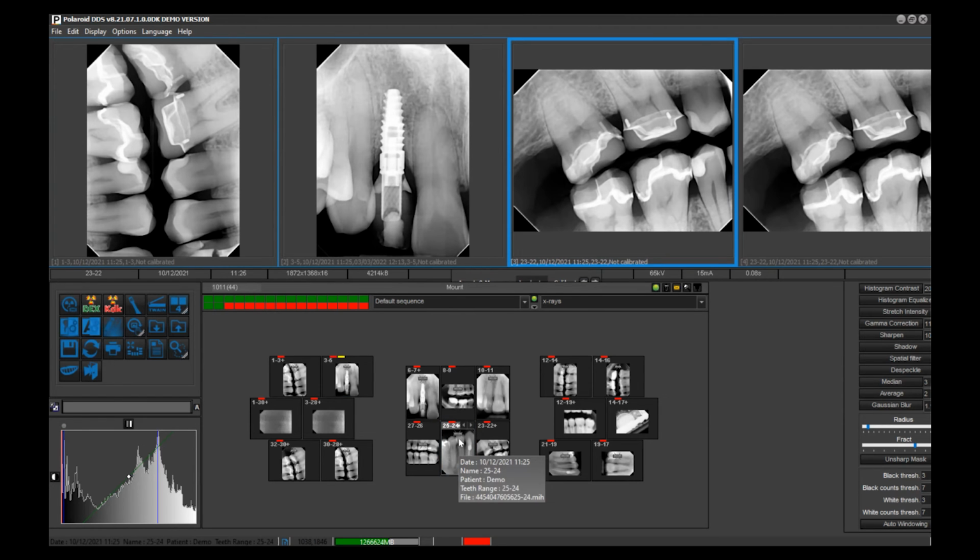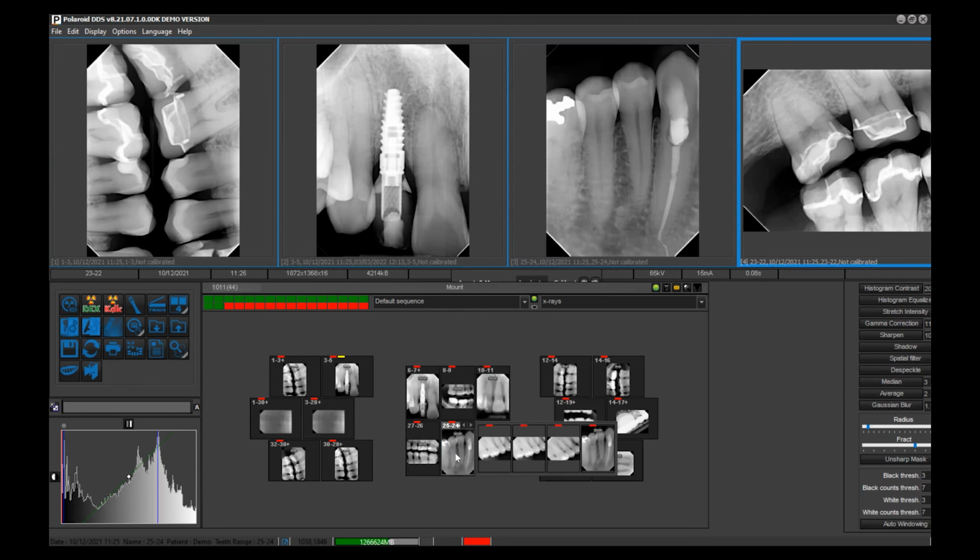But when you press and hold this button here, oh, there you go. You see that? Now, these are different X-rays, but again, I just threw some in there. But here, you would see the history of the different X-rays throughout the years, months, whatever it has been. It'll be that particular tooth in chronological order. Okay, excellent. So that's a nice little feature there.